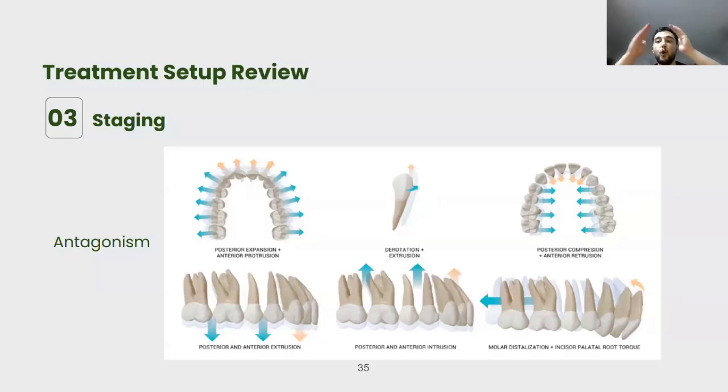The teeth are all expanding at the same time, and we don't have anywhere for the aligner to depend on for the anchorage. So of course, most of these movements are not going to happen according to plan, and you're just going to end up wasting time.